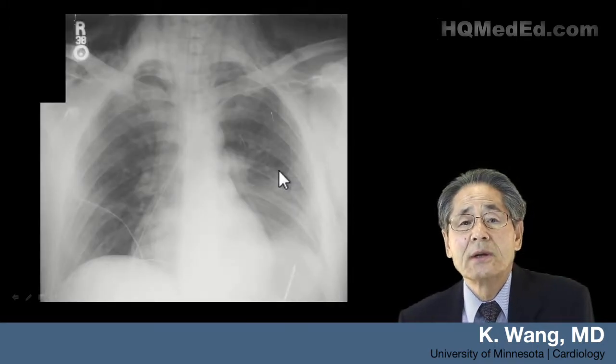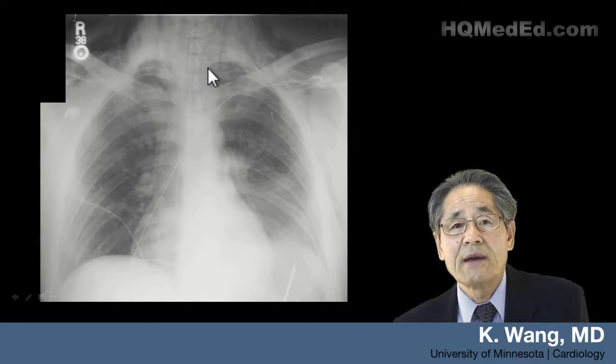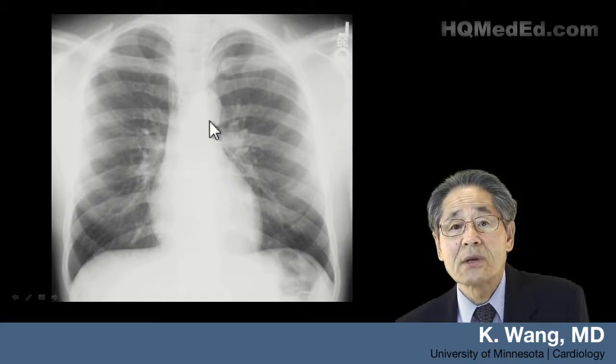Well, this patient, the findings are not subtle. Pneumomediastinum with a subcutaneous emphysema extending all the way to the neck. So pneumomediastinum, sometimes it could be as subtle as this, but again, the double line is the clue here.